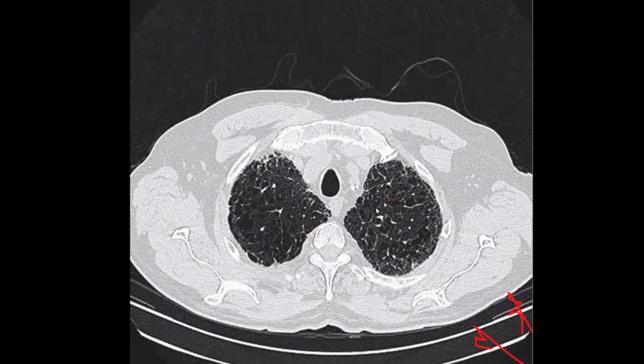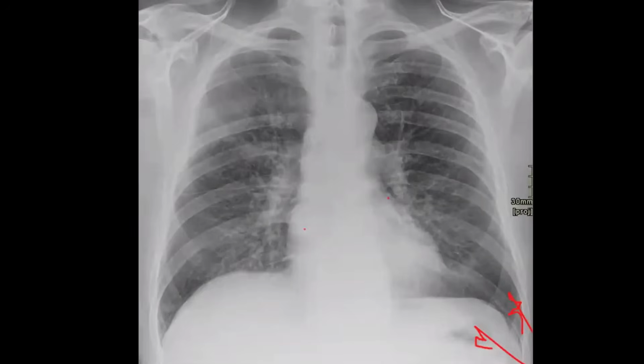Thank you so much. Can you keep with me, please? Yes, sir. Okay. Can you tell me what you see here in this case?